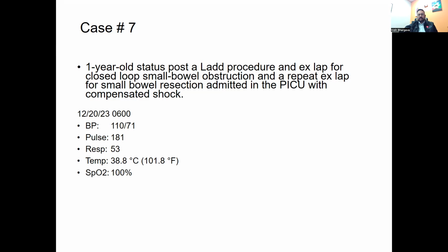But in this case, without using POCUS and having an understanding of the lung ultrasound, we would not have been able to make that case right away and prevent the harm that could have happened by putting in a chest tube. So those are all the cases I have for lung ultrasound.